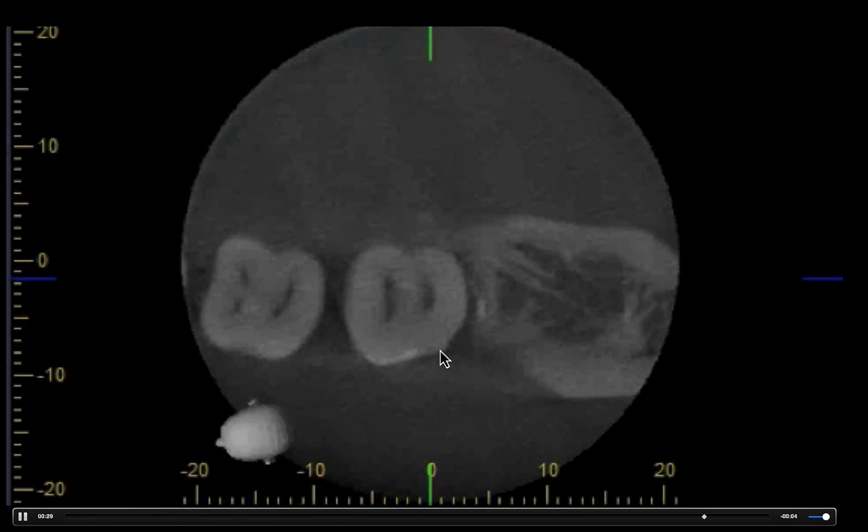And remember, on your bite wings, enamel is a lot more radiodense than dentin. So if we just take a little bit of enamel off on the buccal, and then we take a two-dimensional projection that only looks over here, and everything in the way of the x-ray beam gets stacked up on our two-dimensional projection, it can look very much like a little ding of external cervical resorption burrowing right in the distal of this tooth, when really it was a harmless little scuff of enamel from the buccal that requires no treatment at all. And this is great information for this patient.